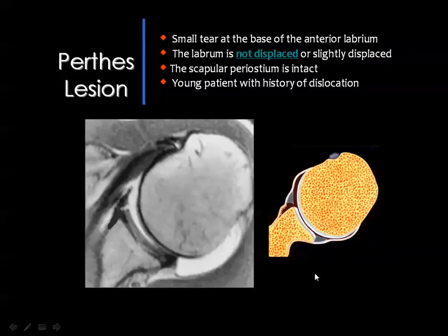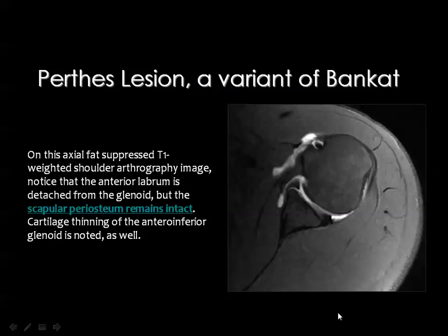One of the important issues is whenever you are going to evaluate labral injuries, you see the injury at the base of the labrum, and you don't see the injury at the apex. The apex is freely mobile and cannot be injured easily. Then whenever you see abnormalities in the apex of the labrum, you know these are normal variants, like the cleaved or the serrated labrum, but injuries of the labrum will affect its base, which is fixed.